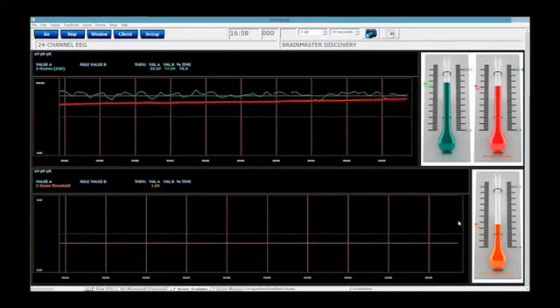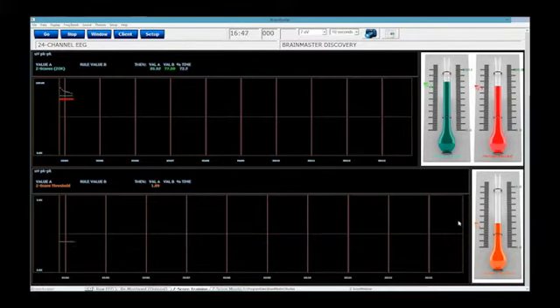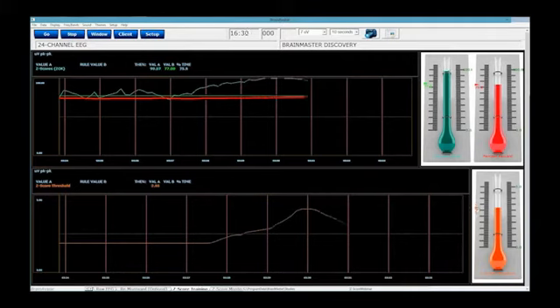This threshold can be adjusted two different ways actually. In the BrainAvatar software, the U key is going to raise my threshold by 0.1, or 1/10 of a standard deviation, and holding the Shift key down and hitting the U key is going to lower it by 1/10 of a standard deviation. Or, thanks to one of the new tricks we built into the software, if I click this little thermometer thing right here and move it, it is going to raise or lower my threshold.